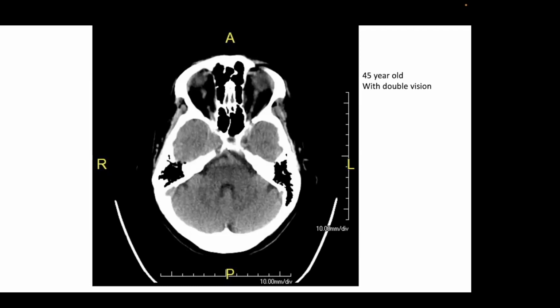Now I'm showing you the cavernous sinuses. It looks different on this side than this side. Exactly. Yes, this was large and it's not appreciated.